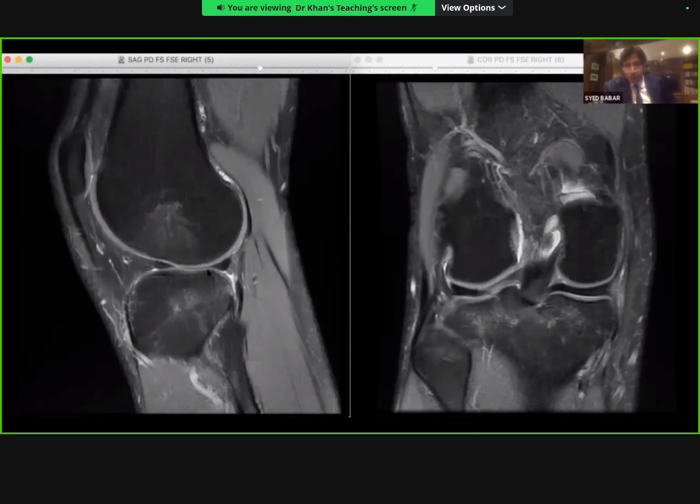And of course, in an exam situation, we completely understand there'll be lots of pressure on you. And because of that pressure, there's an urgency to quickly run through the images. Now, remember, in most exam situations, there'll be multiple findings, and you have to correlate everything together in your mind. That's what we always tell our registrars, how you're going to correlate everything together.